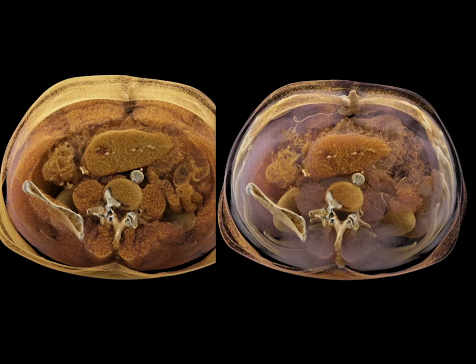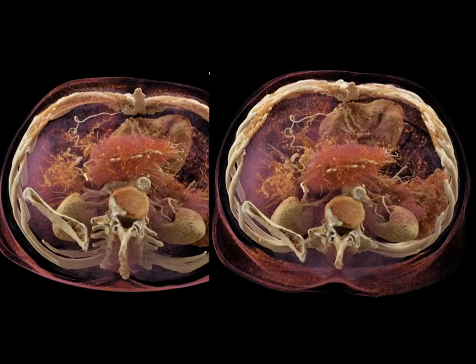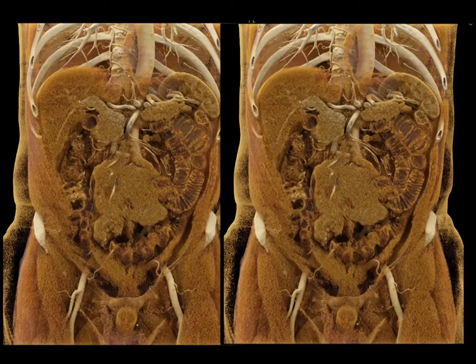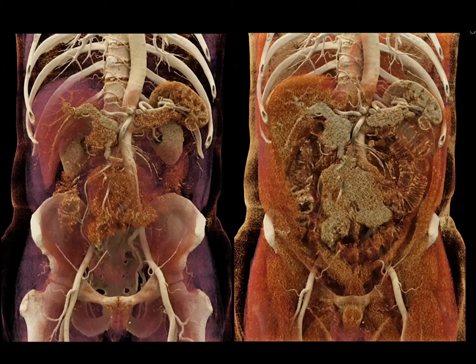Same patient with cinematic rendering. Again, that mass in the mesentery. It's not like you have multiple discrete nodes. It's best defined as an infiltrating tumor in the mesentery, nicely extending along the vessels, and then when you look from above, it's growing straight down, solid, mild bowel dilatation, but no obstruction. So just a very nice example.